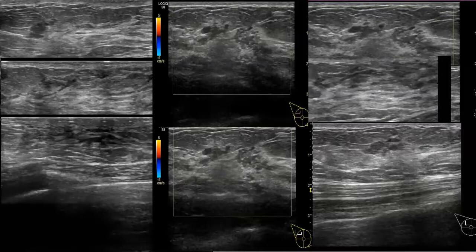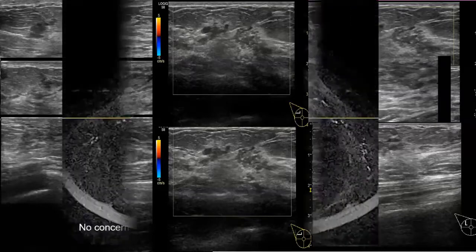Okay, parenchymal lesions for biopsy associated with ductectasia, and there are some small cysts scattered in both breasts. So the patient has lesions in the outer upper central area and bilateral fibrocystic changes.